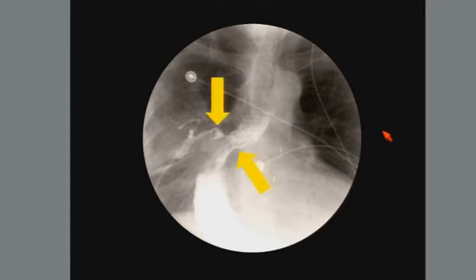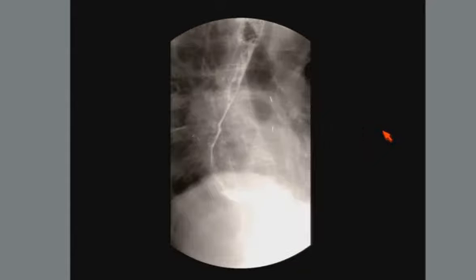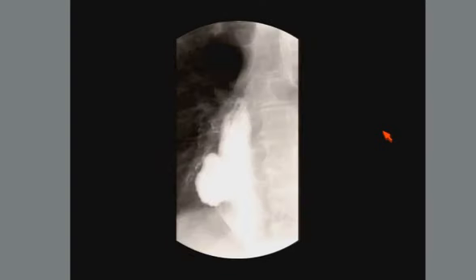As in this case, here's another case, a different patient with a leak at the anastomosis, communicated with a bronchus on the right, you can see here. So a stent was placed. We saw no more communication with the airway. However, the patient was brought back because the stent had passed distally. The endoscopist removed it, and we brought them back to see if they had a leak.